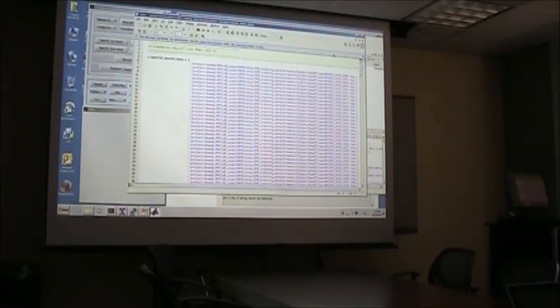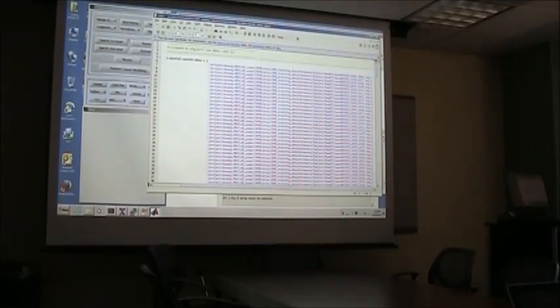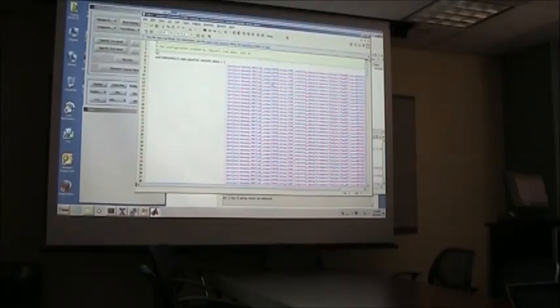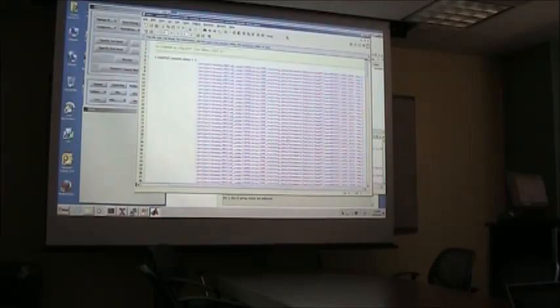Right now maybe you're trying to learn these pre-processing steps, but at some point you have a large data set and you're familiar with how all this stuff works. You maybe do not want to go through all these steps for each subject using only the user interface. What you could do, for example, is make one template. You would set up your analysis for one subject and save it in a file like this, and this type of file you can also just open in a text editor.